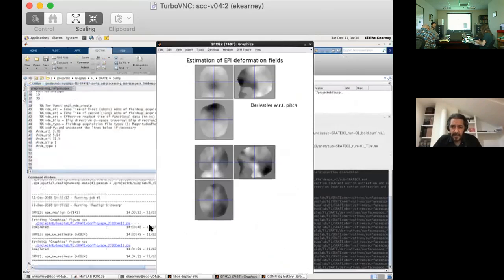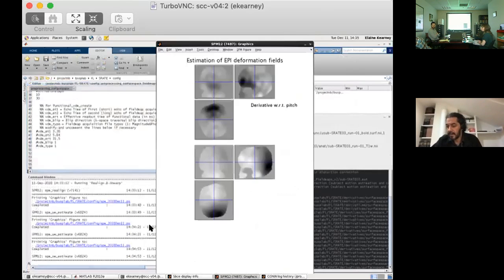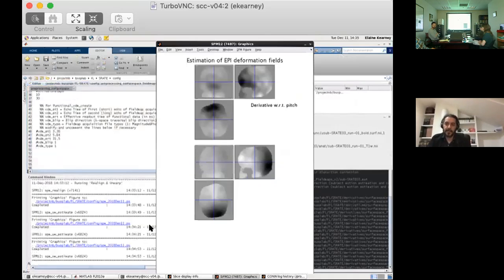I remember talking with Matthias about this J plus minus, and I thought he had some source, or at least he had figured something out. I don't remember. I remember that at some point we looked into the DICOM header reader to find a particular number, but I don't know for sure, though we can do that.